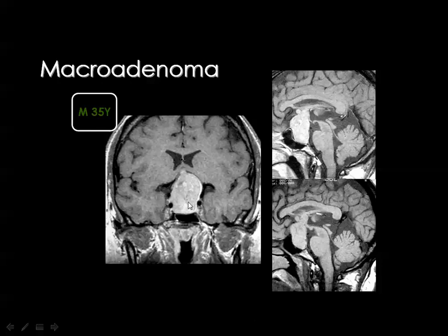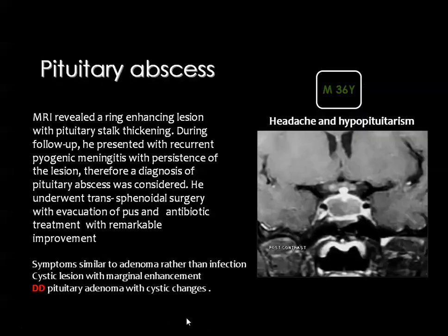In this adenoma, you can see obliteration of the suprasellar cistern, compression of the chiasm, as well as the hypothalamus. Considering the parasellar extension, looking at the internal carotid artery, you cannot see tumor tissue lateral to the internal carotid artery, meaning that there is no cavernous sinus invasion.